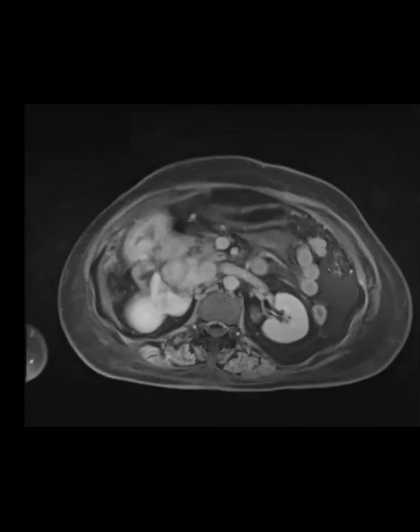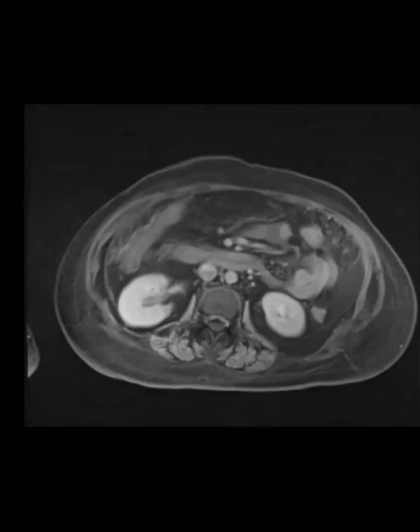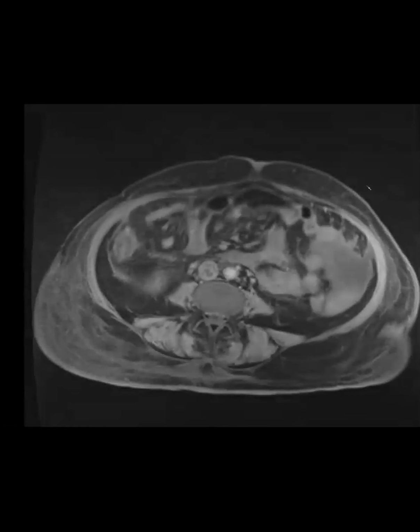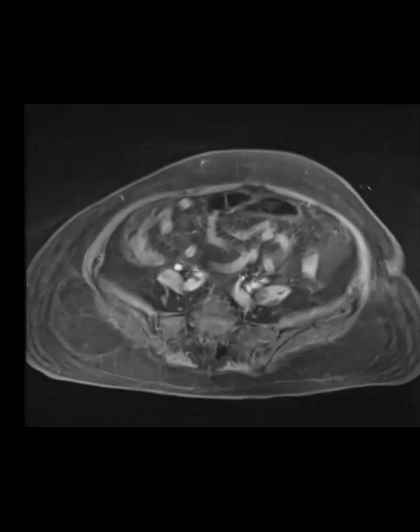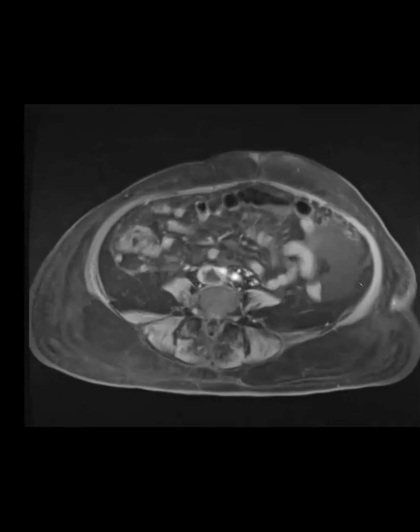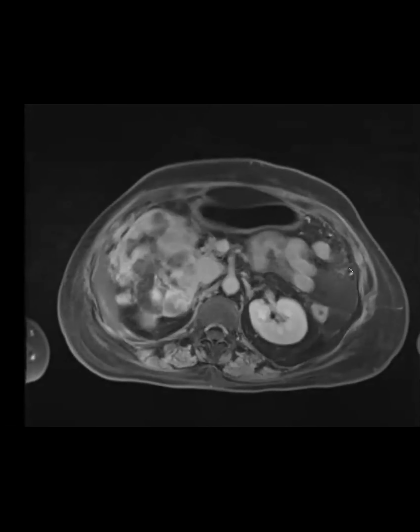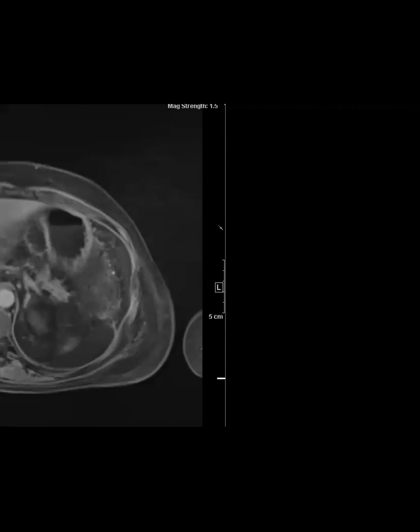Do you think this is peritoneal disease? How hard would you come down on it? It kind of looks concerning for peritoneal disease, those nodules that you showed anteriorly. Yeah, exactly. I find it sometimes tricky because the omentum can be very vascular, but we raised the possibility of peritoneal disease here, and also because of that nodule behind the liver over here. And they ended up getting a PET.